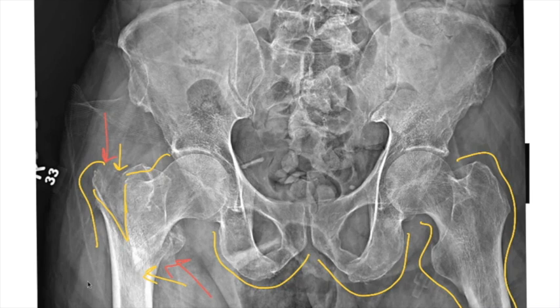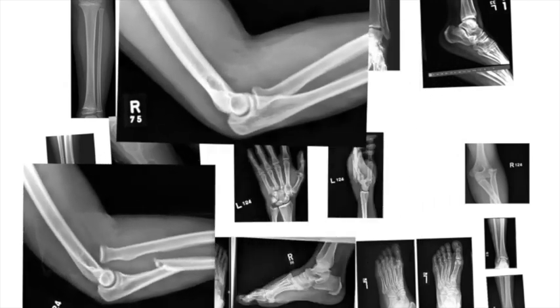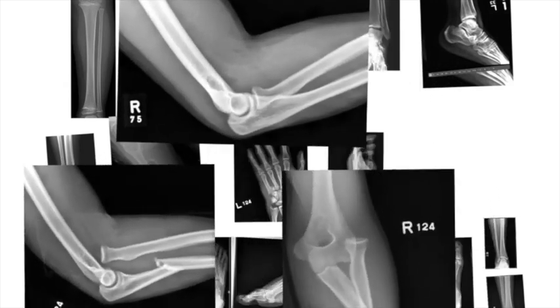Now when you go ahead and look at the joint space, you'll notice it's pretty smooth. So the joint remains located, meaning that it's in the correct location, as opposed to dislocated or outside the correct location. So let's grab another set of examples, and we're going to look at these 3 images of the elbow.